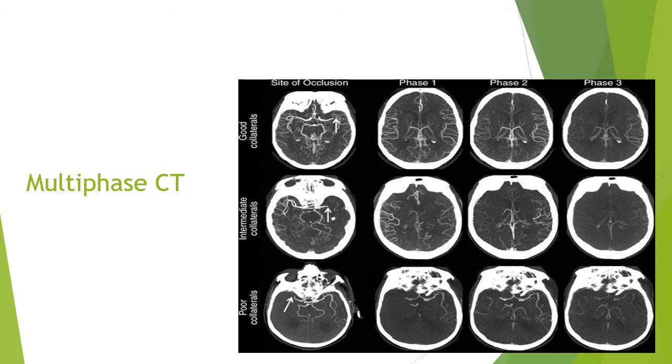Looking at our image here, we can see that the image starts by looking at the brain with vessels full of contrast. Then, as the stages progress, the vessels begin to empty, and we can evaluate how well that contrast is moving through. While this picture is of a head, the same principle applies to the legs.